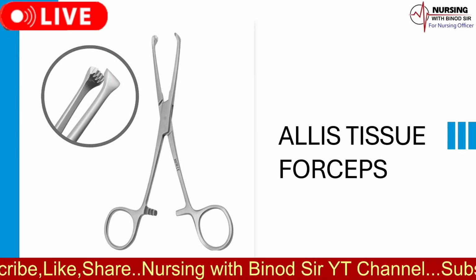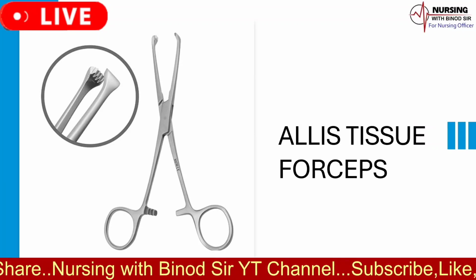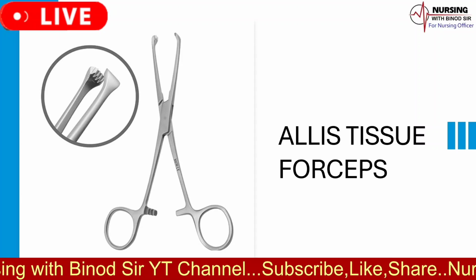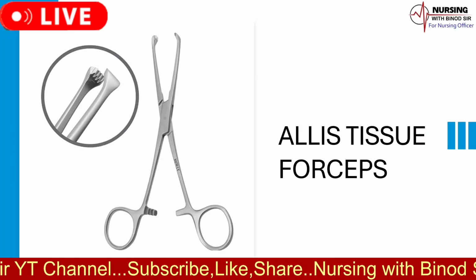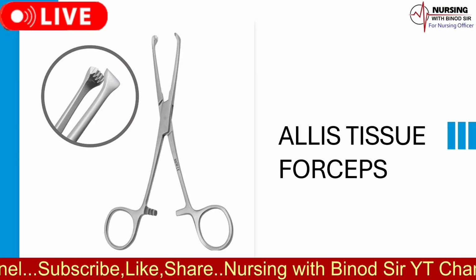4. To catch hold of the torn ends of the sphincter ani externus prior to suture in repair of complete perineal tear. 5. To catch hold of the margins and angles of the uterine flaps in LSCS after the delivery of the baby, as an alternative to Green-Armytage.